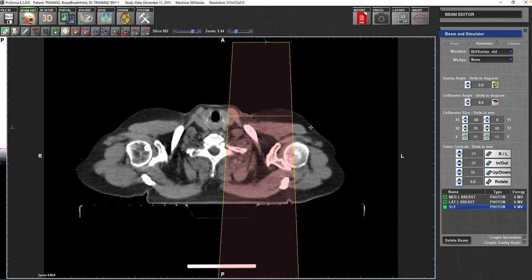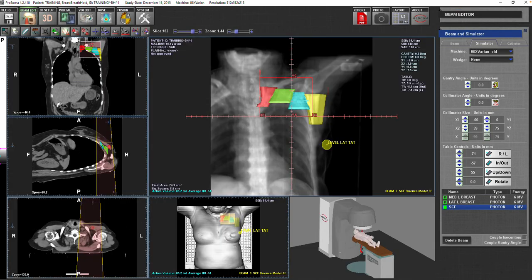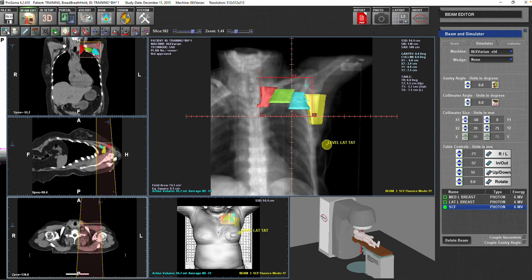In this case, if you want to cover this region properly, meaning the cricoid cartilage level, then you will need to go higher up, clearly. So you may need to open your target more than that, and then you end up covering your cricoid cartilage region. And that's why you will see that in some centers the upper border is different.